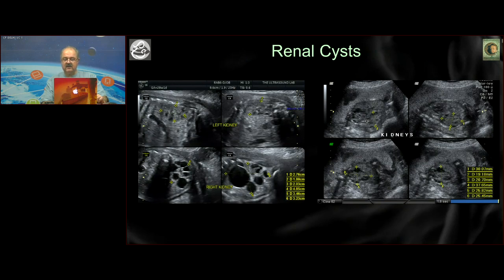This is the classical kidney that we call the obstructive dysplastic kidney, best seen in this fourth image here and this third image over here. That there are large cystic spaces outside on the periphery, and that is what looks abnormal. If you do a casual glance, you will never pick this up. But if you're aware of the condition, you will always pick this up, and that becomes useful because it has a tremendous bearing on the outcome.